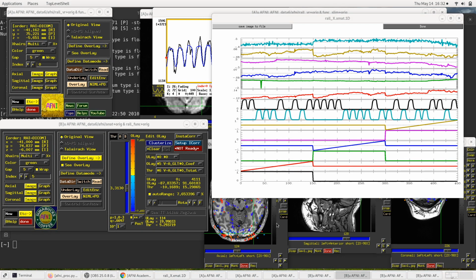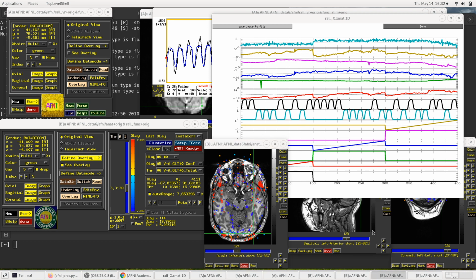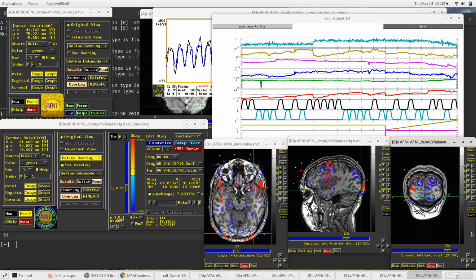So now a lot of the voxels have lost their color. So let's verify now what colors they do get and why. First of all, at our current voxel, you see we've got 3 volumes here. We've got an underlay volume, an overlay volume used for color, and a threshold volume used to turn on and off color, or to allow or disallow color at each voxel.